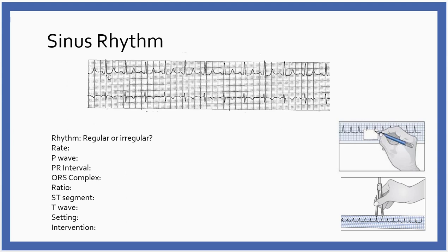The next thing I look at is ST segment, and so remember, I've got my QRS, and then this right here is my ST segment, so it's between the S wave and the T wave, and you'll notice something about the ST segment. It is depressed. So let's go back to where I can find the isoelectric line. It looks like my isoelectric line is up here, and when I draw across, I notice that I'm a baby box worth of depression, because it should be up here. So I do have some ST segment depression in my lead 2.